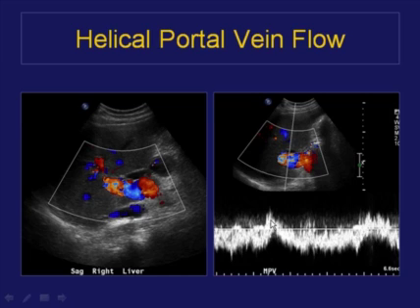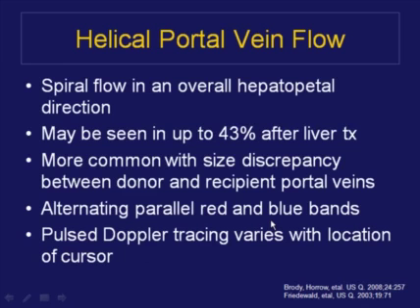Totally fine, totally normal, typically will resolve eventually. And it can be seen in many patients. Also probably has something to do with a mismatch in size between the donor and the recipient portal vein.